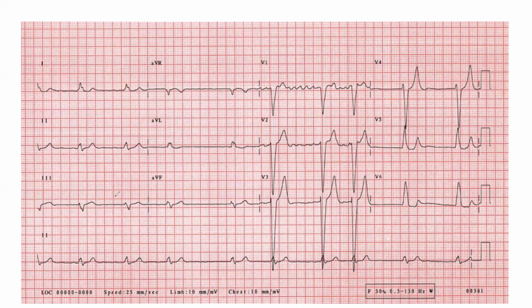QRS, is it wide? Yes. Okay, so we do have a supraventricular rhythm and we do have a wide QRS complex. So what does it mean? Would it be a left bundle branch block? Yeah, we do have an intraventricular conduction abnormality, and we have to look at V1 and V5, V6, and immediately you can see that's a left bundle branch block. Wow, finally, great, I'm happy.